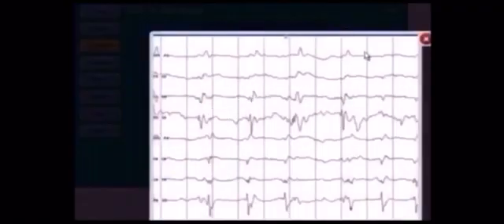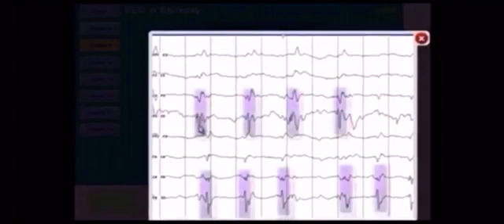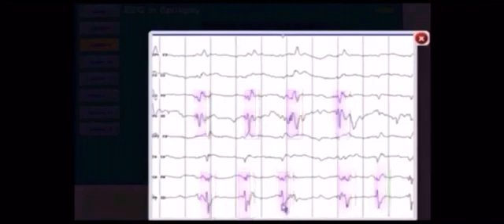And let's move on to this one. What do you see here? So this is an EEG which is slow. So you're looking at the left hemisphere and the right hemisphere. There are sharp waves with maximal amplitude in the occipital region. So both O1 and O2, you see these sharp waves here. So these are occipital sharp waves. And this EEG suggests that this person has a high risk of seizure onset from the occipital head regions bilaterally. So the correct answer, select occipital sharp waves. This is the correct answer, and we've gotten it right.